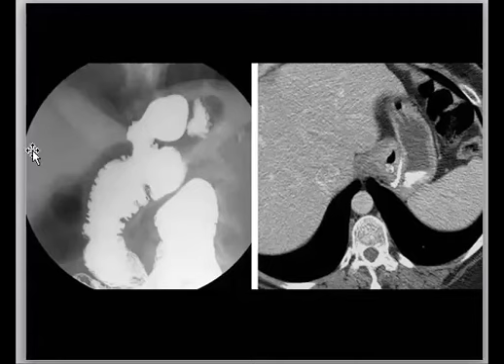So the complications could be leaks at the site of anastomosis, narrowing or stricture, or a gastrogastric fistula as in this one. Could be that the excluded part of the stomach recovers again and becomes much more distended, right?